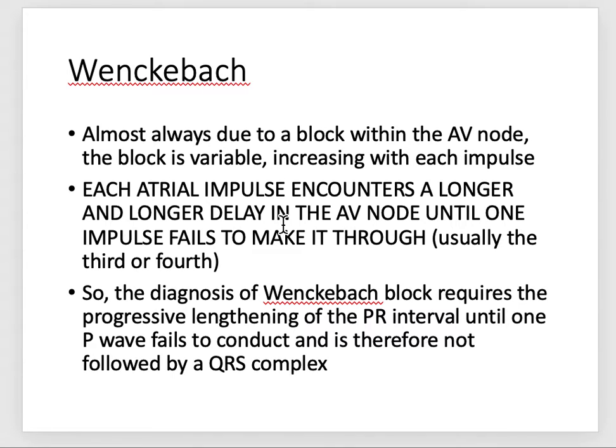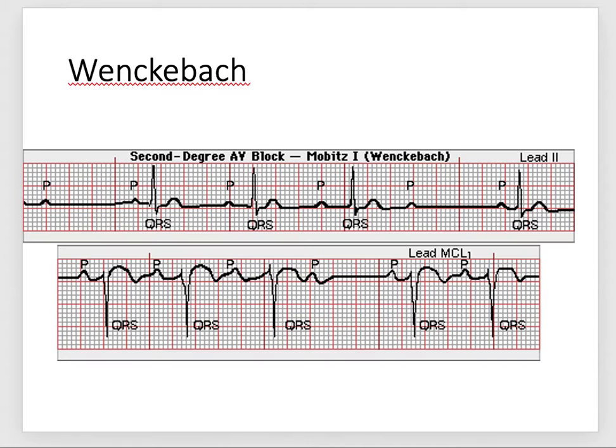So Wenckebach, right? The YouTube video, the song, as I laugh just thinking about it, helps us to understand that it's progressive lengthening of the PR interval until one wave fails to produce the QRS wave, right? So you just saw this, right? Longer, and then fail to no conduction.